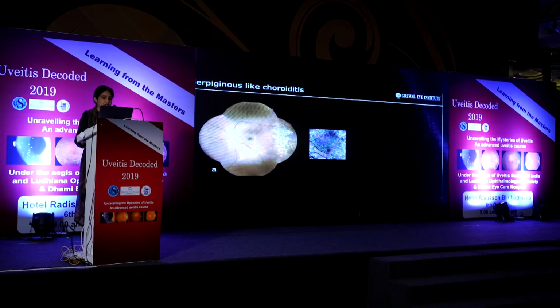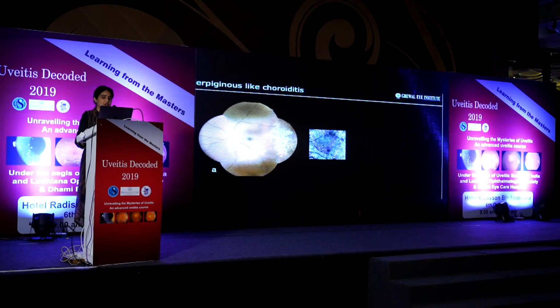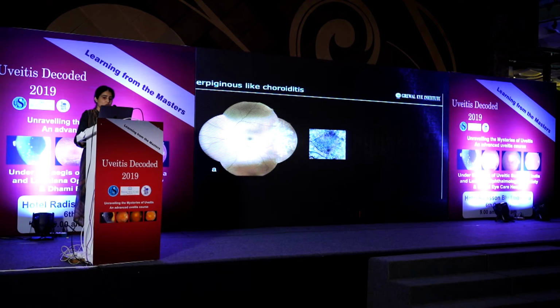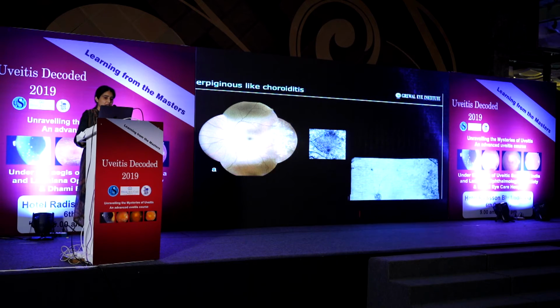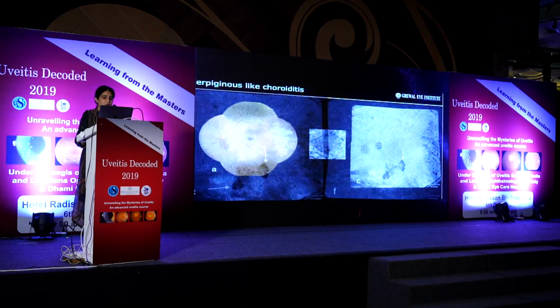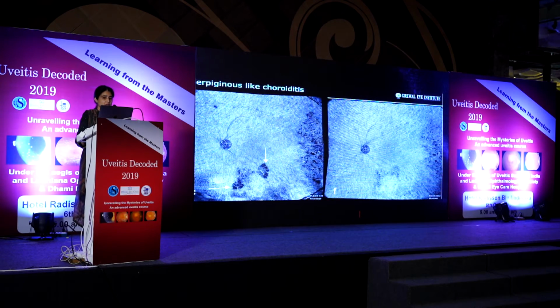It's an example of this lady with a tubercular choroiditis. It's an active lesion at the inferior mid-periphery, which you can see pointed out with the white arrow. But as soon as you run your OCTA standard scan, there's nothing much that you can see. But on an OCT montage, this lesion is very clearly visible, and you can see the hypoflow at the lesion, suggestive that it is an active pathology. And 3 weeks after treatment, the same lesion shows signs of healing, as that little flow void that you used to see earlier is disappearing.